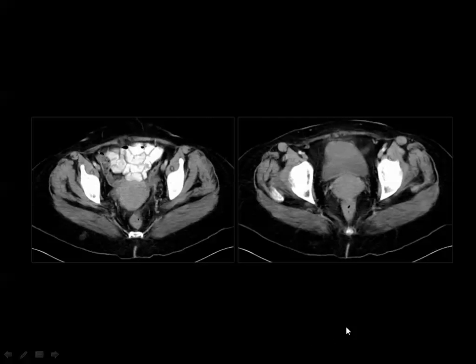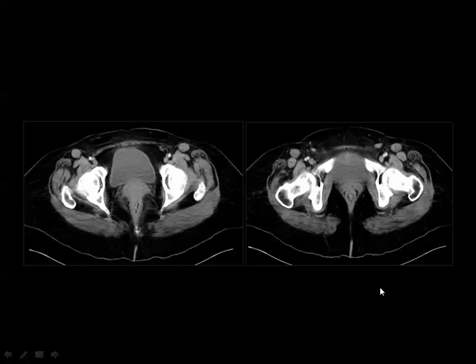And here in this example, you see the uterine corpus, and lower down, this is the urinary bladder, this is the uterine cervix, which is located between the bladder and the rectum, as you all know. And this is the final image when you reach the distal part of the cervix, and this is the vaginal vault, this is the anal canal, and this is the urinary bladder. And here, of course, the ischiorectal fossa filled by fat on both sides.